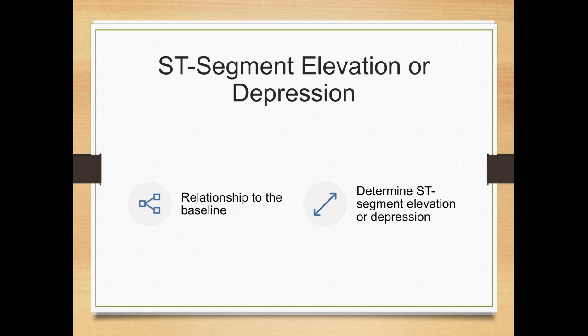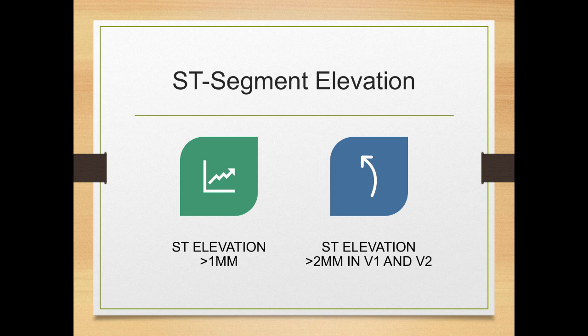The ST segment should be back at baseline. If it's anything higher, it is elevated. If it's anything lower, it is depressed. So we either have ST elevation or ST depression. We are going to be focusing a lot on ST segment elevation coming up and talking about STEMIs, heart attacks, myocardial infarctions, and these ST segment elevation myocardial infarctions.